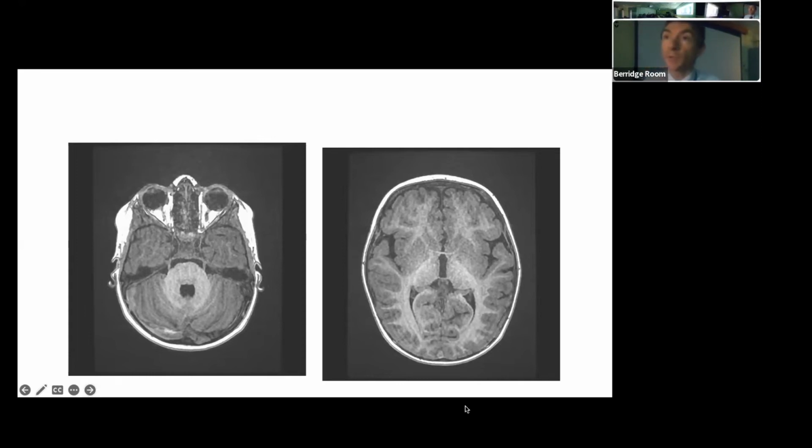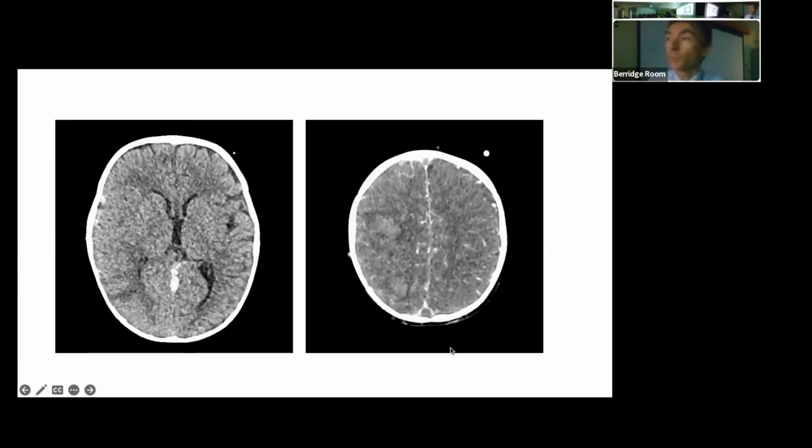Okay, let me just go on to the next slide. So I think actually all those 4 images were done on the same examination, and then this is a week later. He had a CT scan and a CT venogram when he was in hospital having these seizures and generally not very well. This is the unenhanced CT. So again, like the first case, you can see high density here in the straight sinus. The thalami look normal on this occasion.